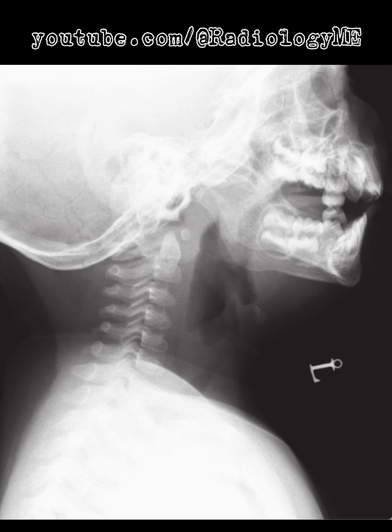Moving on to the lateral neck radiograph from the same patient, there's dilatation of the hypopharynx and narrowing of the subglottic trachea. These findings, again, are consistent with croup, and the prevertebral soft tissues appear normal. The epiglottis looks unremarkable, which helps rule out epiglottitis in this case. This further strengthens the diagnosis of croup, particularly in light of the radiographic findings.